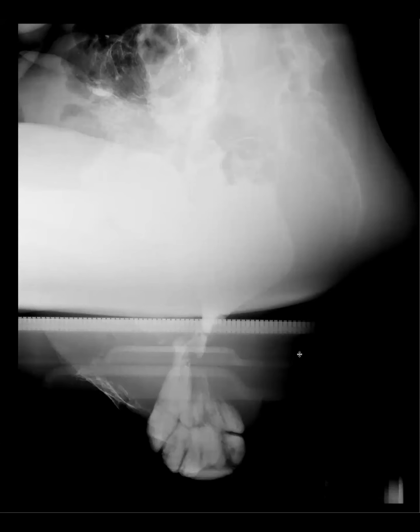So it's very drastic outlet obstruction because of an eversion, right? Yeah, exactly right. It's exactly an eversion because everything was already pexied. I wondered if sometimes the pexy actually acts as a tether and drags it down. Yes, that's exactly right. So that point was already pexied up, so the lower rectum was fine, but then the sigmoid, or upper rectum, came down, and this is what we see.